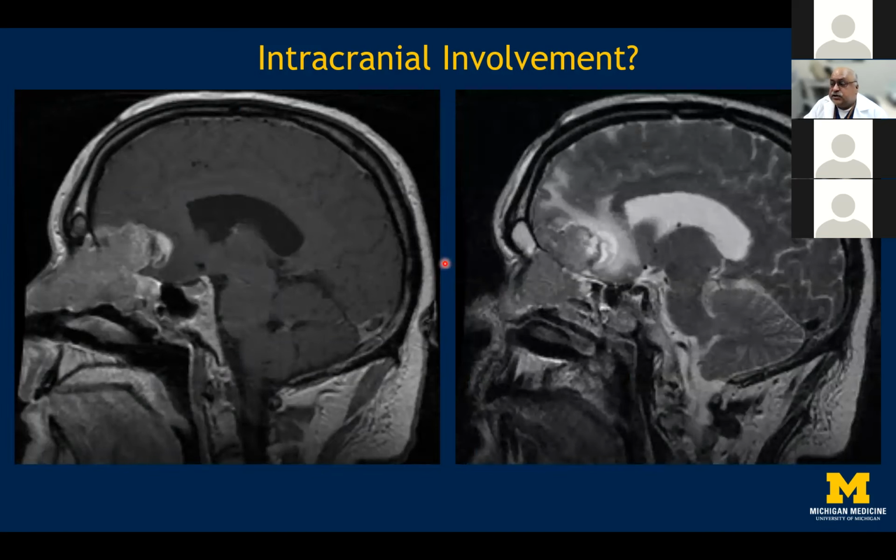The limitations of the T1 weighted and T2 weighted sequences are shown in this study, where the T1 weighted sequence may show a featureless brain. However, the extensive edema around the tumor, which is an extension from the ethmoid sinus, will let you know that the extent of the involvement of the brain is far more than what is expected. Remember that FLAIR or T2 weighted hyperintense signals in some instances may represent an active edge of the tumor, although there may be no enhancing component to these tumors as well.